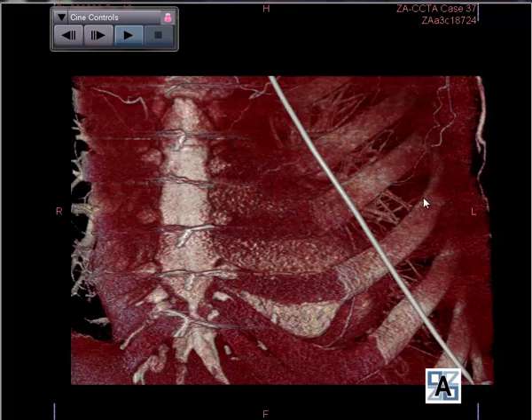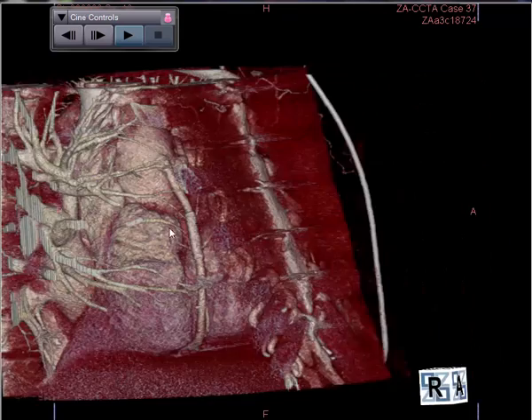Evaluation of coronary bypass grafts can be quite challenging, but it's relatively straightforward if you use a systematic approach. We can see here that this is a full view of the three-dimensional structure. I will frequently switch to a right view as I'm going to rotate around here.